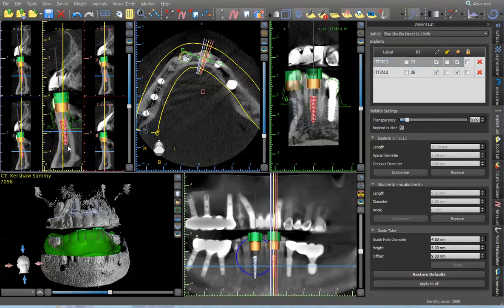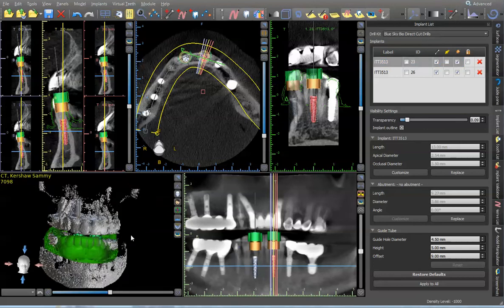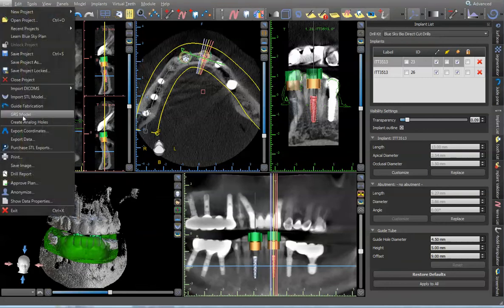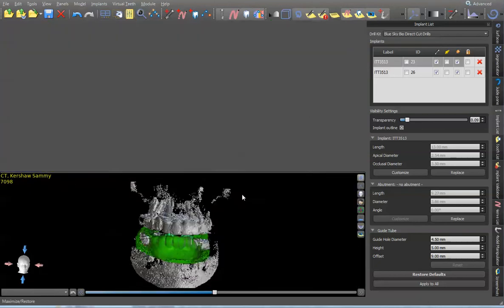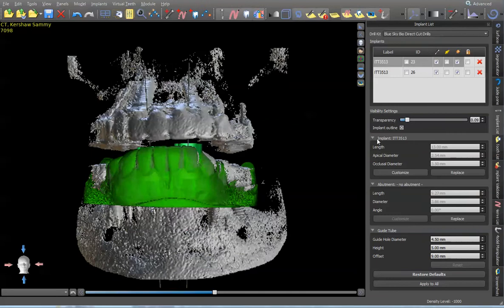And we imported our model. Just going to File, import, import model scan. These are just the DICOM file and stitch it together. So now what we've got to do is make our surgical guide. And we have teeth, and we have this DICOM data, and nothing really looks good.